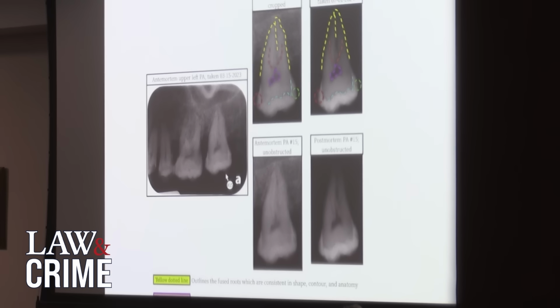And I should also say the reason I took 28 radiographs and you don't see 28 radiographs on the report is because I take as many radiographs as I need to perfectly replicate the angulation that the antemortem before death x-ray was taken at, so that I could theoretically superimpose the images over one another. And in this case, it just took me 28 tries to get the images that I needed.